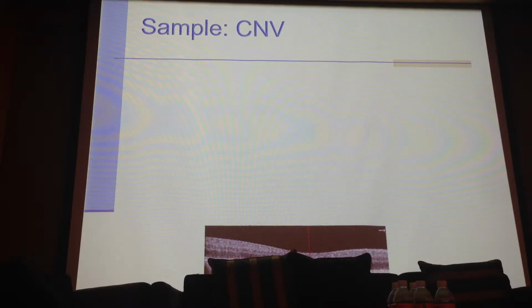For example, here's a B scan with a couple of PEDs, right? For example, here, the one on the left and the one on the right. Who has an idea which PED has the choroidal neovascularization? It's hard to tell, right? But when we switch the OCTA on, now we have the idea. One of the PEDs is totally black. There's no signal, no motion contrast on the left hand, but on the right one, it's full of red signal.